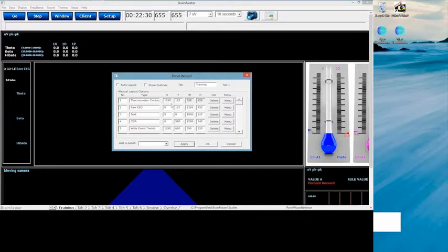Now, as you know, one way that we can do this is, of course, you can go into the XY with height, and you can type in the information and change it. For example, I'm going to go to my text display, which, just so you know, is right here, and I know it's right there because I can see that it begins at X of 0 and a Y of 0. So that's right up here in the top corner. I'm going to notice that the width of it is 1896, and its height is 125. So basically, the width of it, we can tell, does not fit my screen at all, just because of how wide it is.